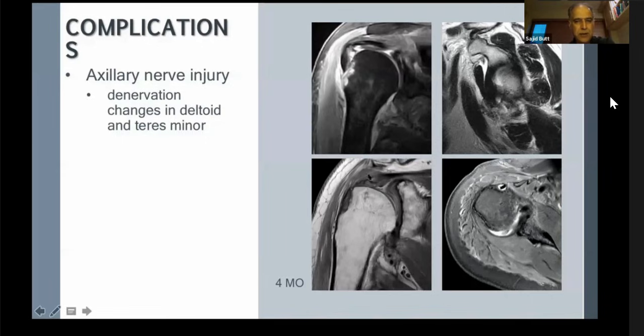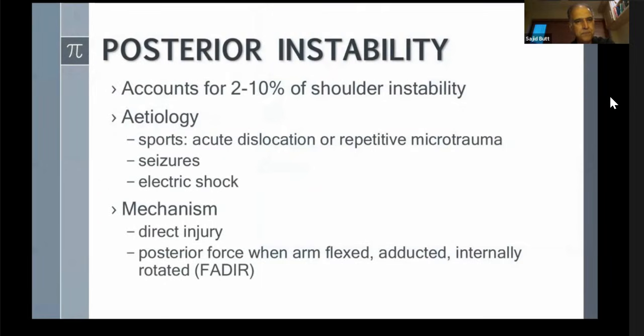But for the gold medal, I want you to see that the deltoid is markedly atrophic, and that's where the normal axillary nerve is running. And look, it's got edema also along with atrophy. So that's abnormality. There's a bit of edema of the infraspinatus at the back. So these are the sorts of things they would absolutely like you to say.